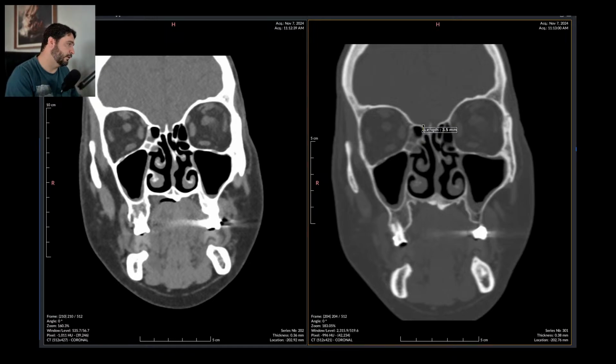Just summarizing the scan so we can finish it up. Right there. Can't really tell anything about tumors, nor radiotherapy, nor signs of a previous surgical procedure. So it's done. It's finished. We are going to the next one now.